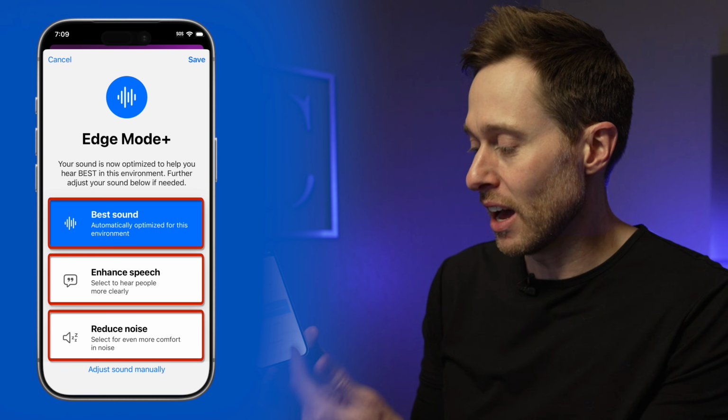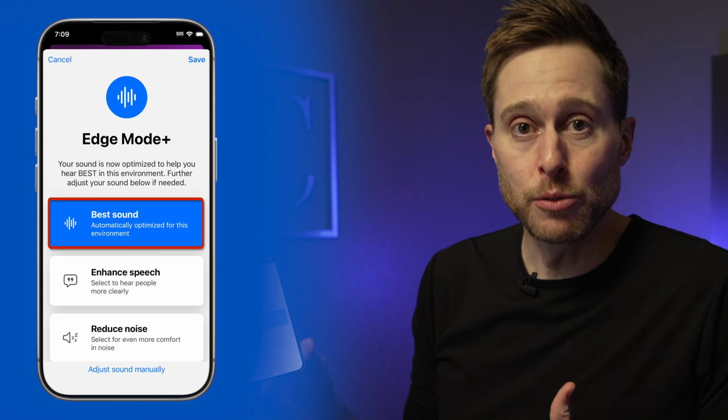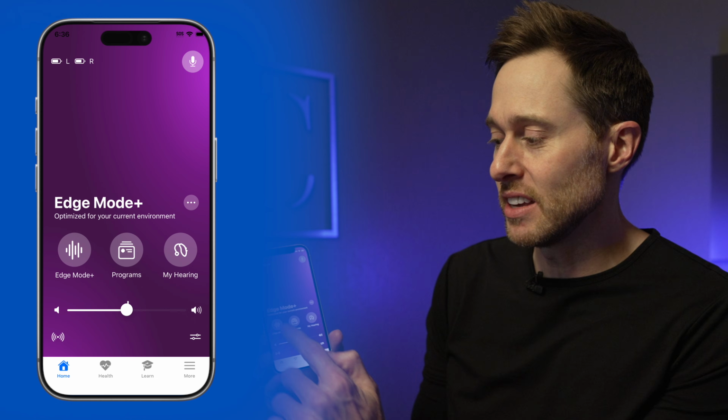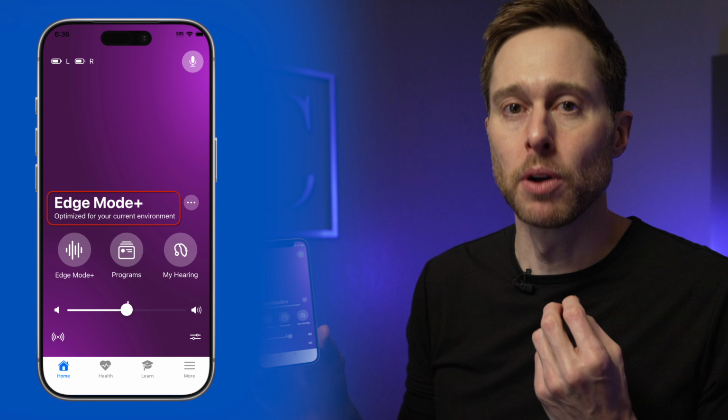And whichever one of those I select, that's what the hearing aids are going to do for me. Right now I'm in the best sound setting. Sounds pretty good to me. I'm in a quiet room, so no surprise there, but I'm going to go ahead and click on Save there. And you can see that now I am no longer in my personal program. I am in my Edge Mode Plus program.